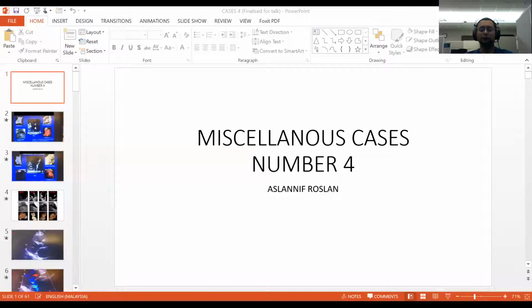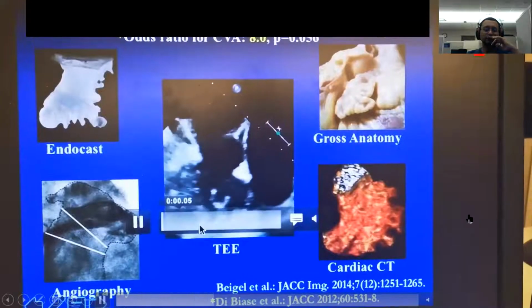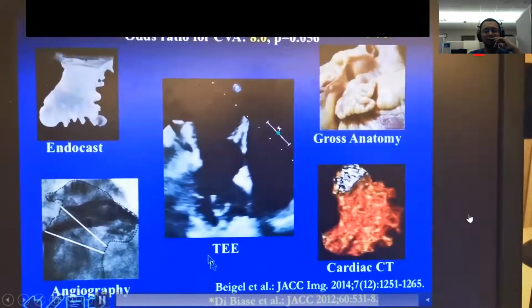So this is number 4. So we discussed together. Tell me if you cannot hear or anything. I'll just put it in the side, the chat group. So let's go for the first case. Okay. So what do you think this is?